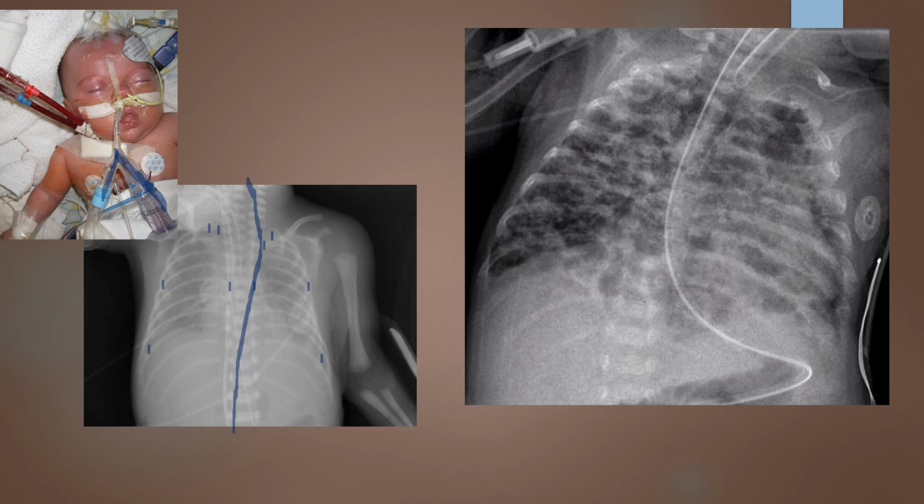Now, you might look at this from more of a critical standpoint and say, oh, they should have collimated closer, and I can agree with you to a certain extent on that. However, if you are running the risk of a baby moving, you don't want to cut it so tight that any sort of adjustment would cause anatomy to move out of the image. So they did a reasonable job here with collimation.